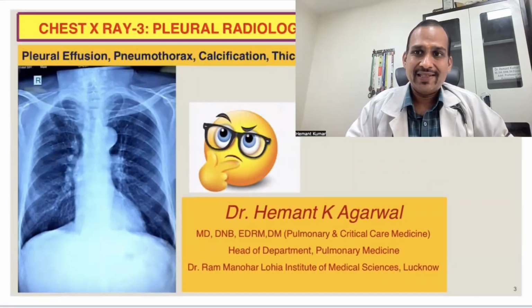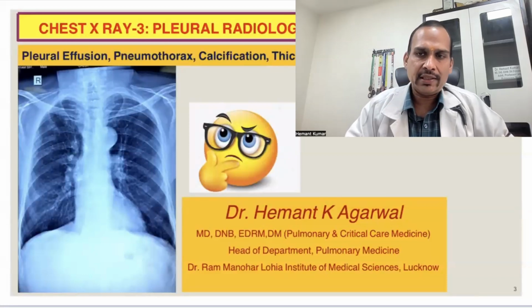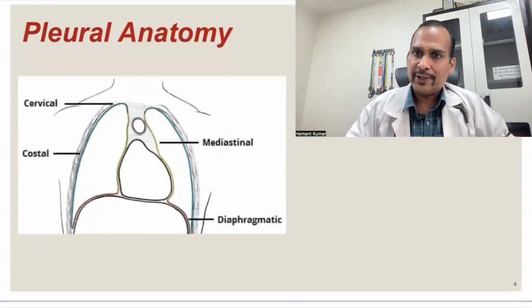Hello friends, in this series of chest X-ray, we will see our part 3, that is pleural radiology. In this part, we will discuss pleural effusion, pneumothorax, pleural calcification, pleural thickening, and pleural mass. So let's see pleural anatomy.